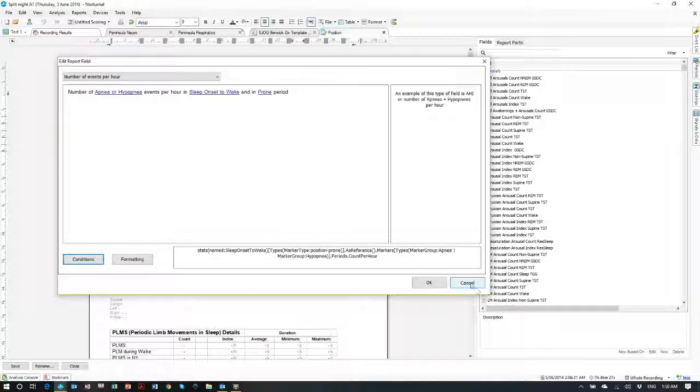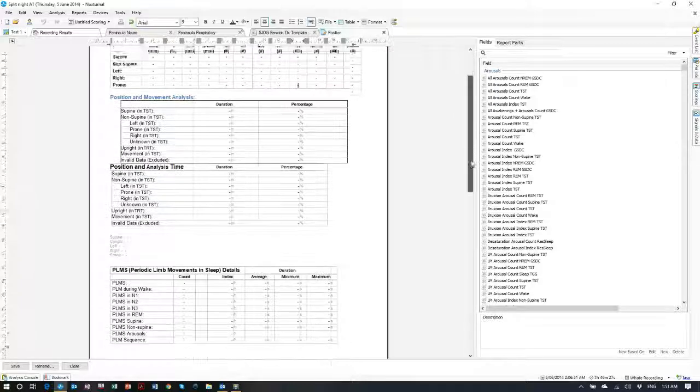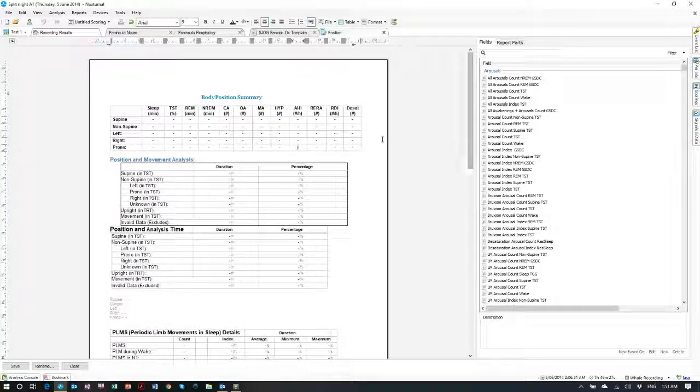This is one of the best, what would you call it, macro builders I've ever come across. It's very, very simple and easy, and all you have to do is have a little think about it, have a look at some of them that have already been produced, and you can start building your own macros very, very easily. Let's just get out of that without running reports, adjusting report fields. We've done all of that. We had a look at that. And I think I've just covered everything on my list.